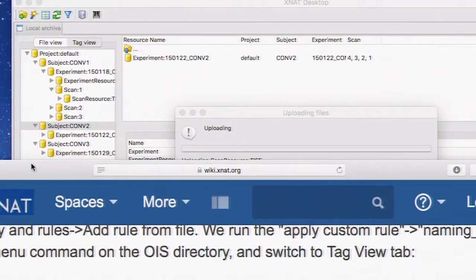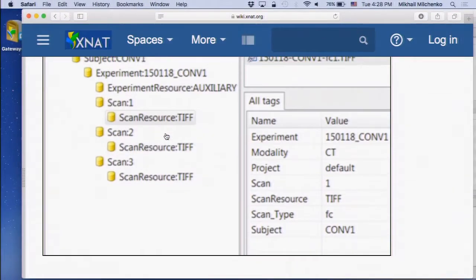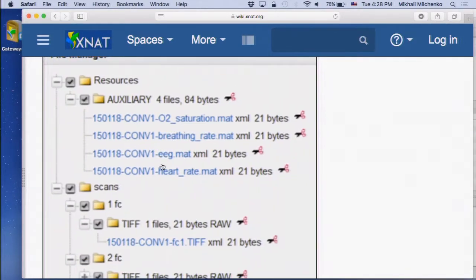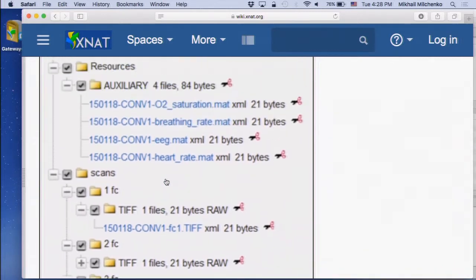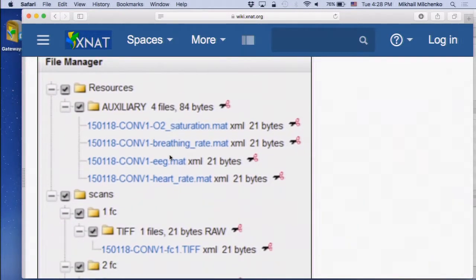And just looking back to the web page, to that project, we'll see that our resource has been populated according to the tags that were assigned, according to that hierarchy that we've seen in the very beginning, how we define the mapping.